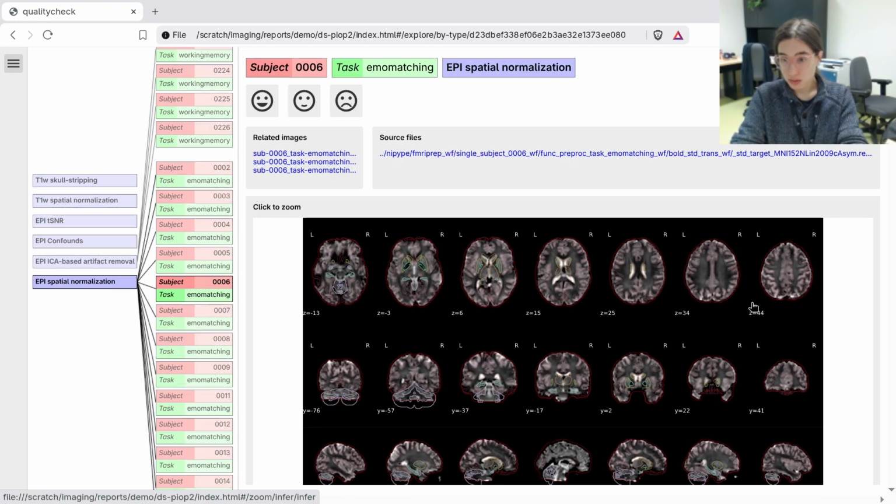until we see some discrepancy, and then we can evaluate the animation in more detail, see whether this discrepancy is just an unusual participant, maybe some unusual brain anatomy, some unusual features, or whether there's actually a problem in processing and we need to exclude that participant. So for those problems in processing, please see the manual for some examples. Okay, so that's all of our 6 images, well, 5 plus 1 optional one.